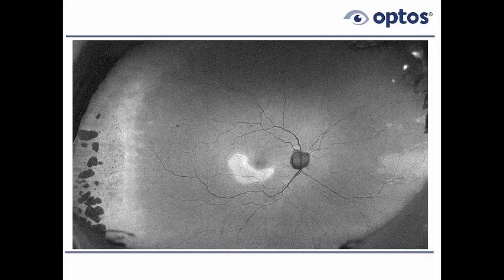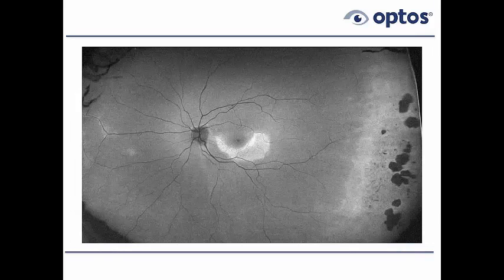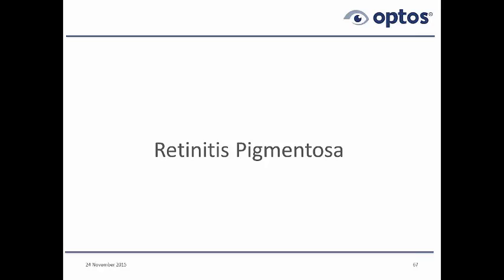So this one's interesting because it is retinitis pigmentosa. We went ahead and got an electroretinogram, a flash ERG. It was down by about 50%, which is fairly typical. We don't have treatment for this disorder at the present time, but we consider putting these patients on vitamin A palmitate, 15 to 18,000 international units, fish oil, omega-3s, and also lutein, zeaxanthin and mesozeaxanthin are recommended. There are some studies suggesting that sort of profile actually does work.